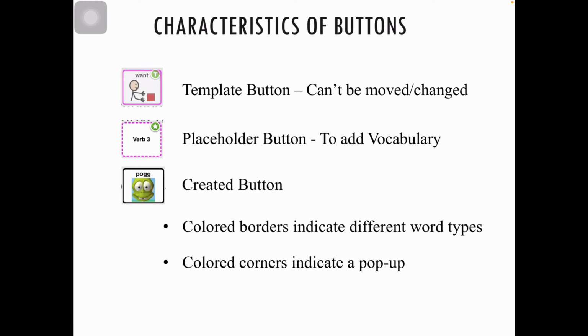When you look at the actual screen, the buttons look different. If it's got a little green T on it, that means it's a template button and you can't do anything to it. If it's part of the template, it stays there. You can't alter it.